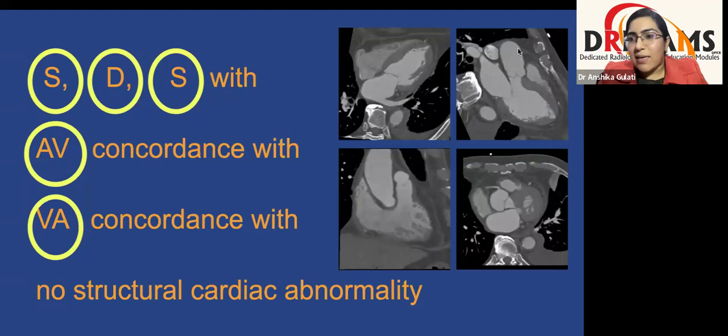This is the last section that we saw, the three-chamber view, and this is the fibrous continuity that I was talking about, seen in the left ventricle. And this is the right ventricle with the pulmonary artery arising from it. And this is the tricuspid valve. You see, there's a huge distance between the tricuspid valve and the pulmonary valve, while the mitral and aortic are in continuity. And this muscular ridge that is separating the tricuspid from the pulmonary valve is known as the conus or the infundibulum, which is a very important identifier for the right ventricle.